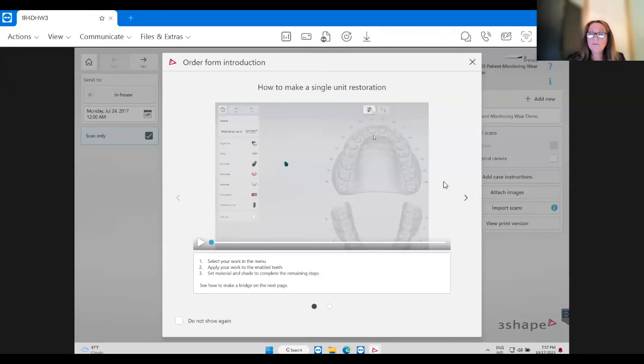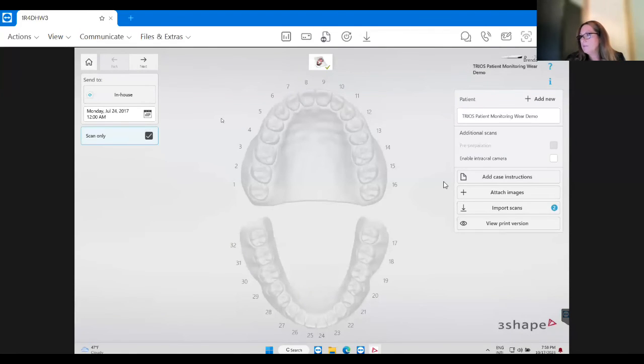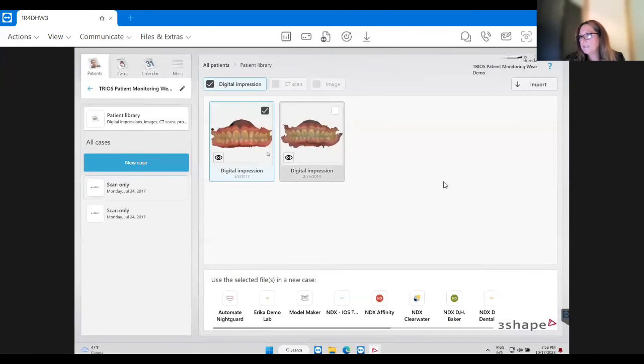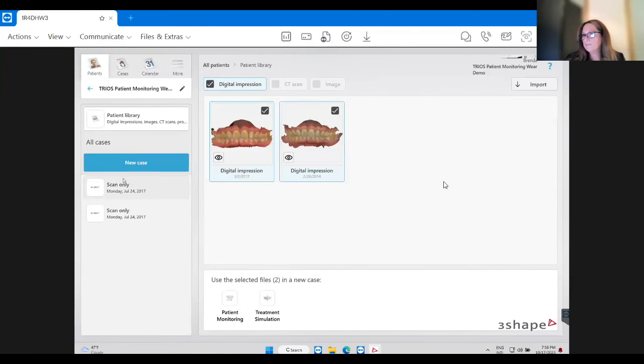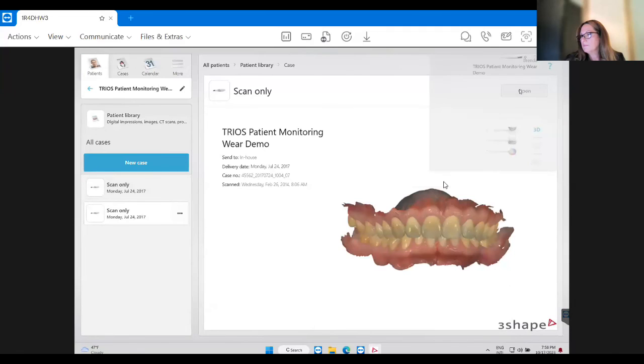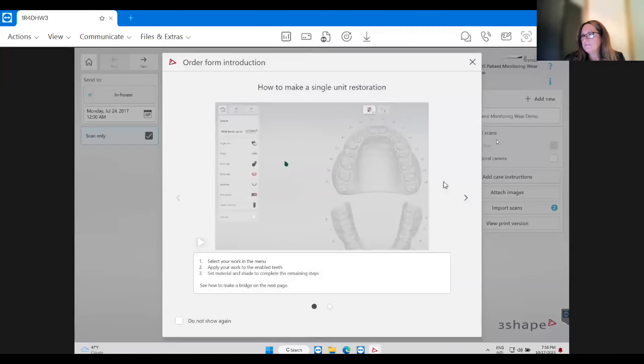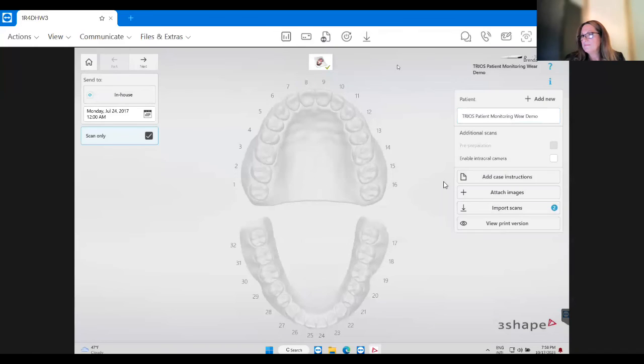And this is good for hygiene, right? So if you wanted your hygienist to implement it, I'm trying to see here. Well, that one doesn't have enough scans in it. Get both of them there. I think I might have clicked on the same one.